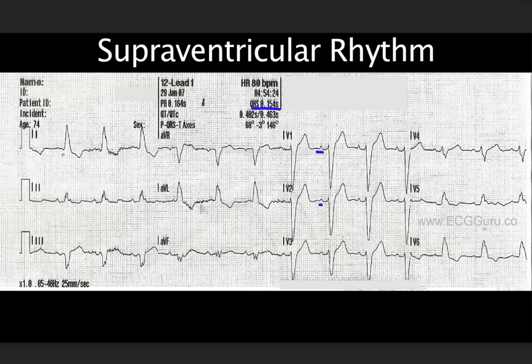And by the way, remember that the 3 channels you use to run your 12 lead are run simultaneously. So each channel is a rhythm strip from left to right. It's a continuous strip, it doesn't stop. But also each beat is shown 3 times, in a vertical line, in 3 different views, but it's the same heartbeat.